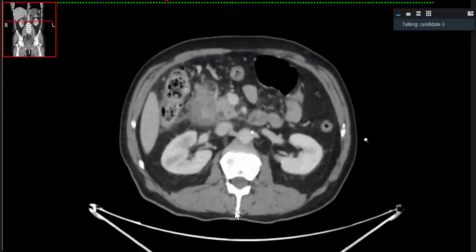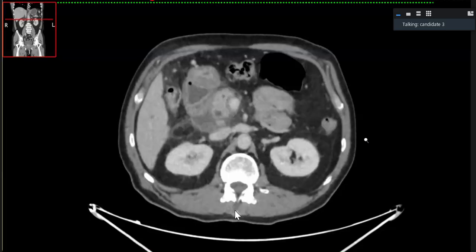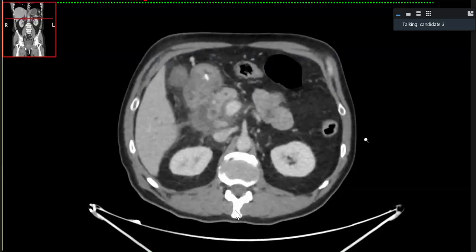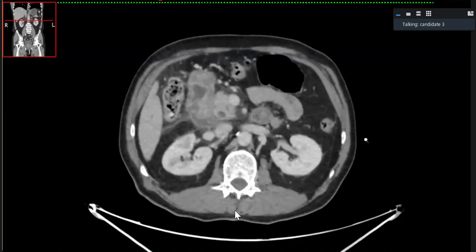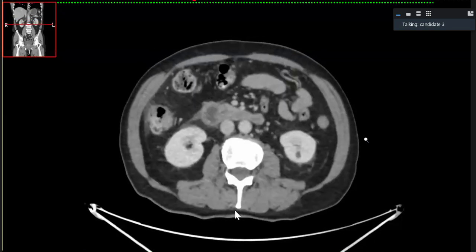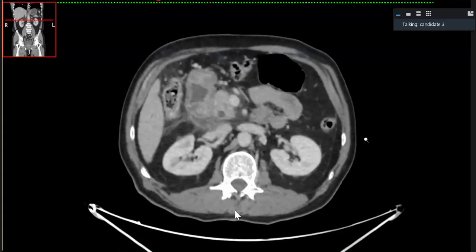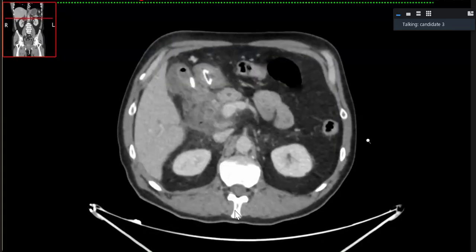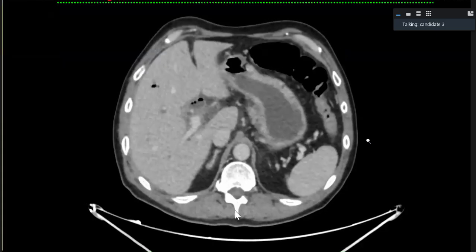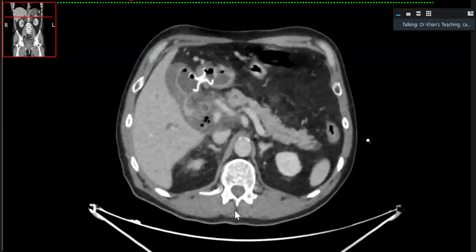Going down further, these are located close to this area of ill-defined duodenal wall thickening. As the patient had some procedure done for obstructive jaundice, my first possible thought is that it can be ERCP done for this patient. So if the patient is post ERCP and this type of finding is there, and the gastroenterologist is concerned about patient symptoms, then this can be due to duodenal injury.